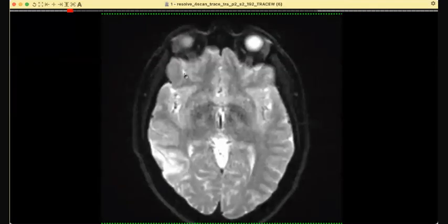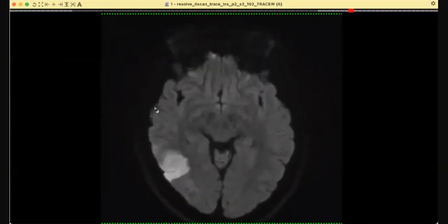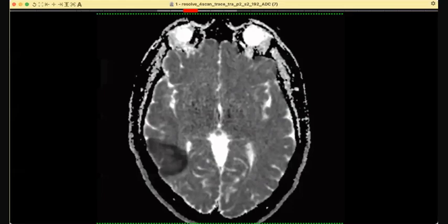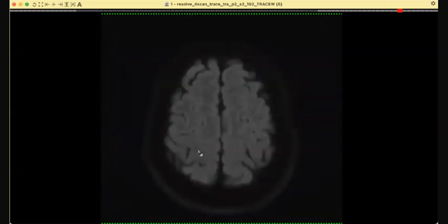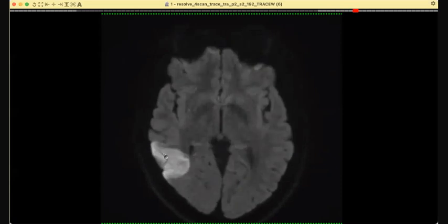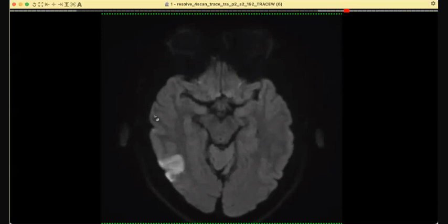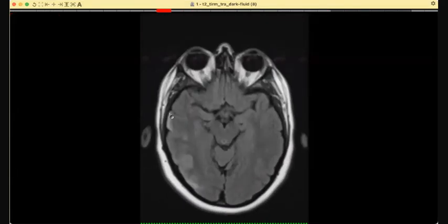And then on this MR, the key finding was restricted diffusion. It was very impressive. Look at the restricted diffusion. Now, try to concentrate here because this is the restricted diffusion. And please remember on ADC, it was also low on ADC. But you don't see anything more here in this region. You see this thing here. And actually, this is a thrombosed cortical vein, this one.